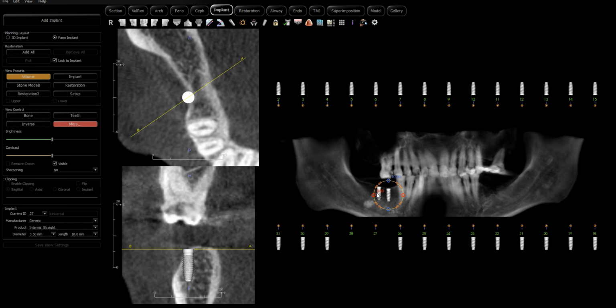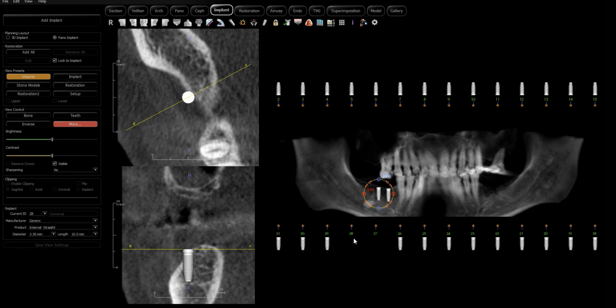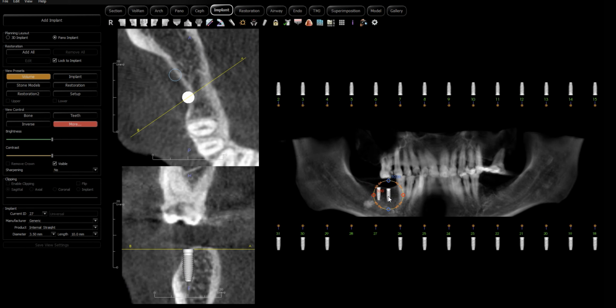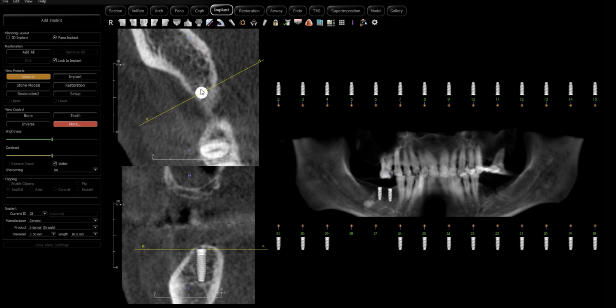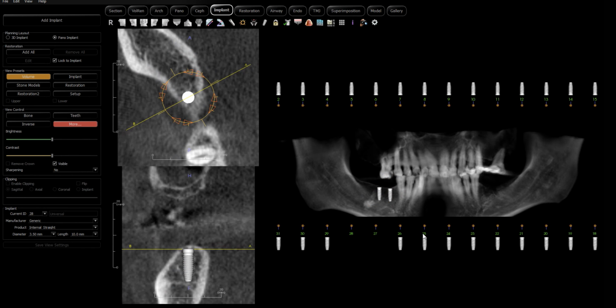The reason it may become important, there are default settings that we can program in here so that every implant that we place in Site 27 will be this kind of implant with these heights and widths. If we decide to do that, that's fine. I think in the meantime, just placing them and then adjusting each individual implant separately has some value at this stage in the game. All right, so I'm going to do something like that.